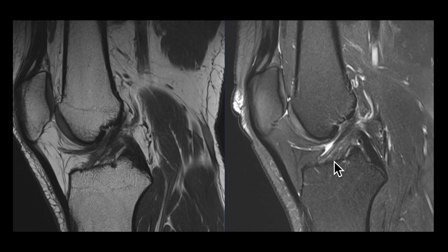The ACL fibers are also not tightly bound, so you can see that there are these areas of intermediate signal, sort of gray signal in between the fibers of the ACL. These are interdigitating bits of fat, and they give the ACL this striped or striated appearance. This is normal and is not an ACL tear. In contrast, an ACL tear will show fluid bright signal between the fibers. You might see thickening of the fibers or loss of tension, or you might actually see complete discontinuity.